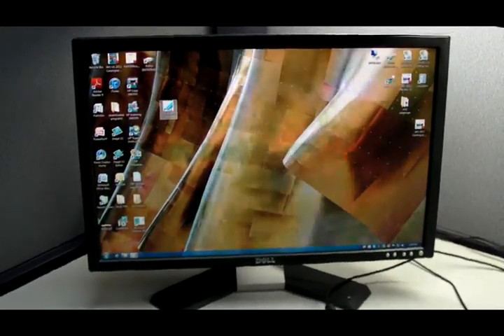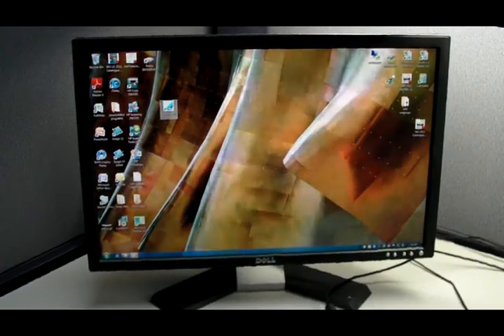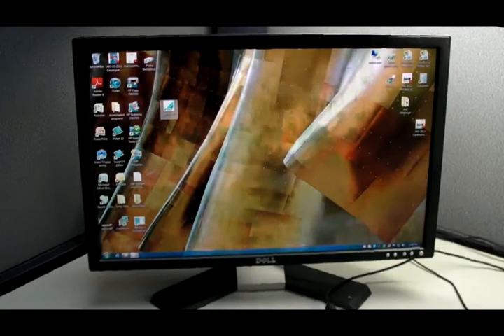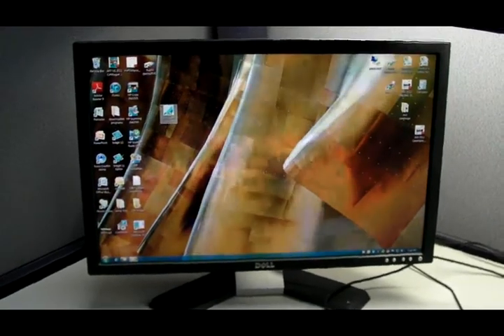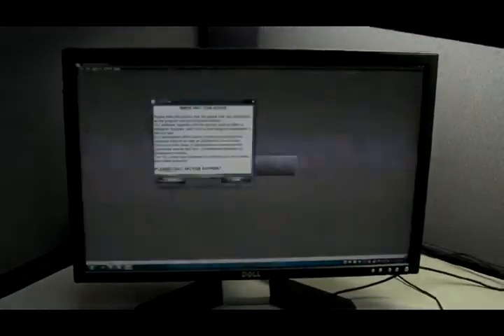Welcome to the basic training of Vet Exam Intro and how to use the CR7 scanner. To open the software, double click on the Vet Exam icon and wait for 5 seconds for it to open. The software will go through basic checks. For this, just press read and understood.